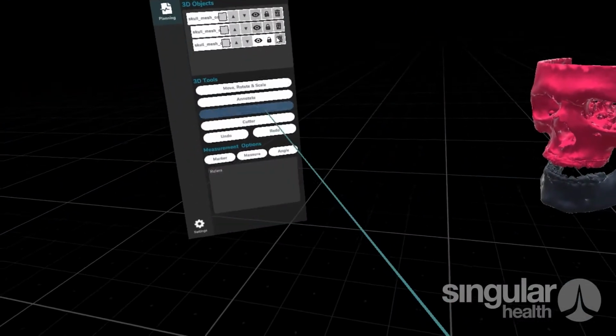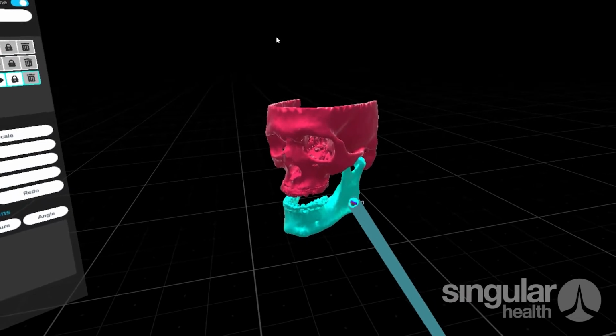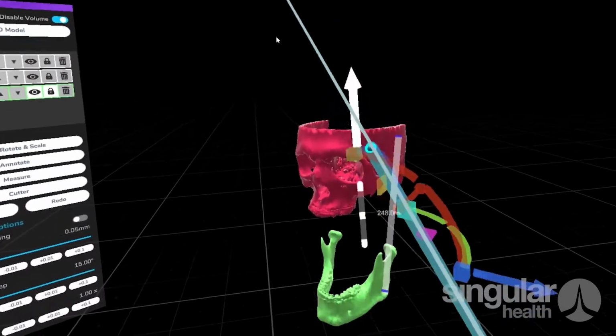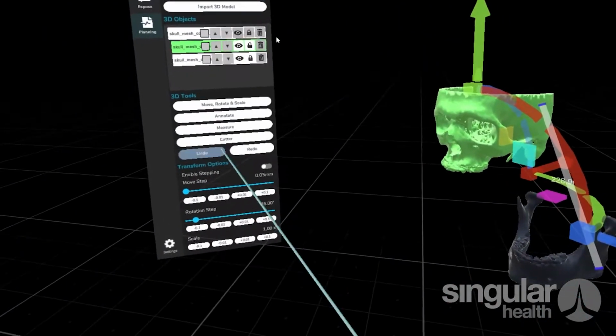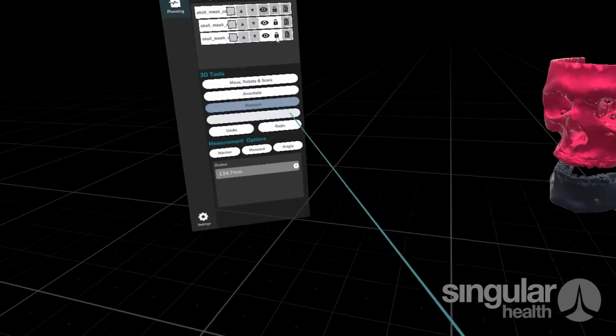However, what's nice as well, we go to the measurement tool, grab our ruler, or multiple, move a ruler from one to the other, and then because we are spanning across two meshes, as we move one, the original point stays to the original mesh. So actually it means we can move these two parts independently, and the measurement will stay the same.